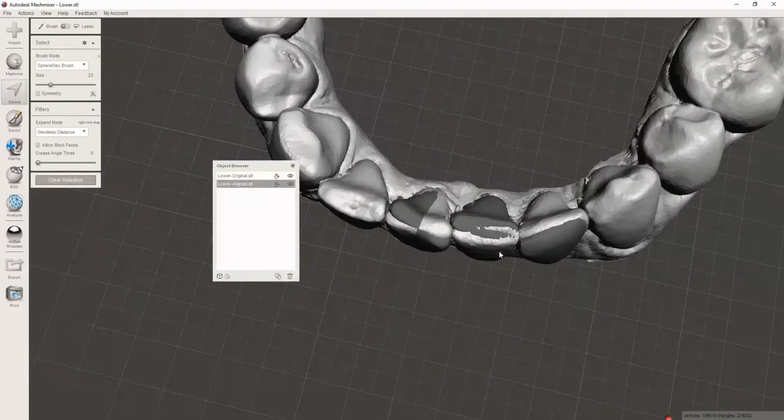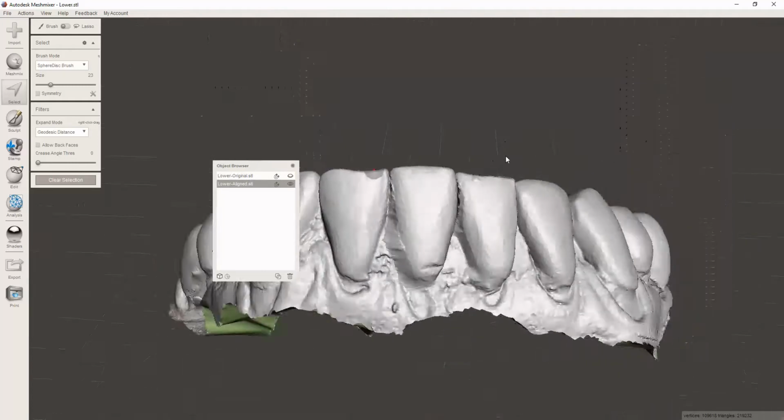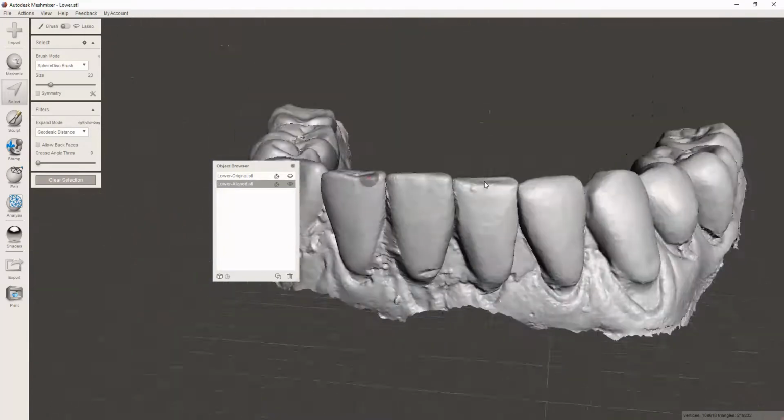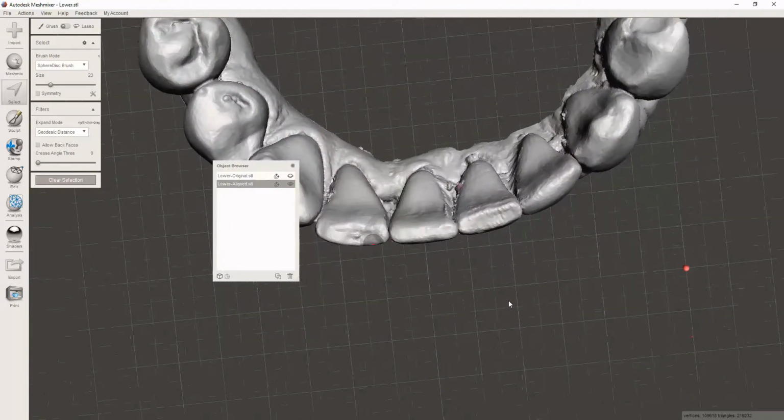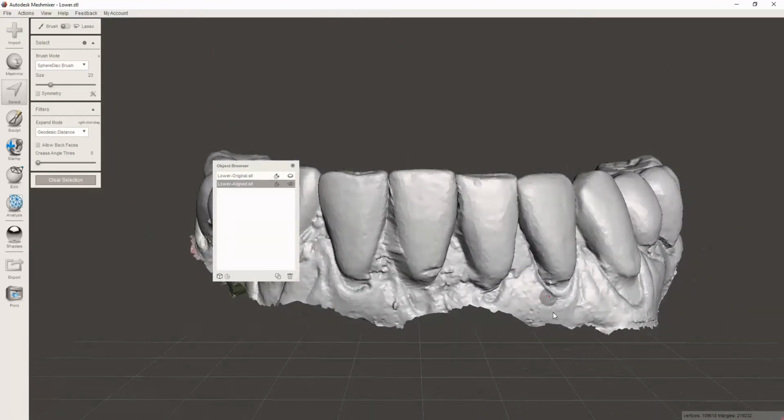So now you can see you've got your before and after overlapped. And let's turn this off. I feel pretty good with that position. That's where we're hoping these teeth end up. Are they going to correct this much? I would say probably not completely, but at least now we know what we're aiming for.